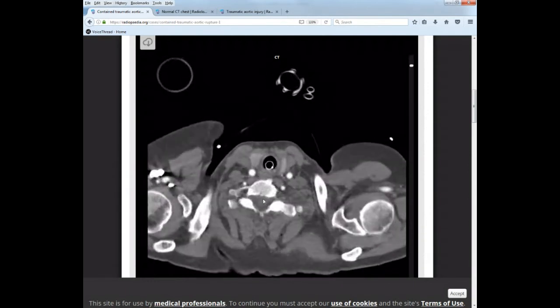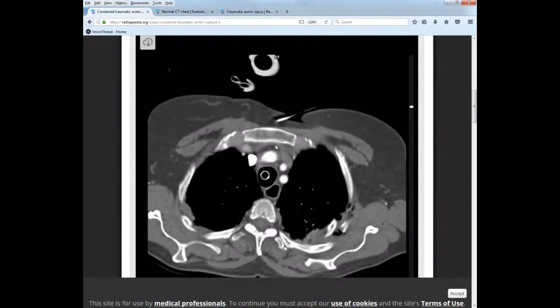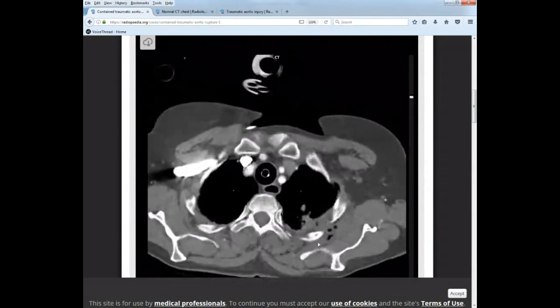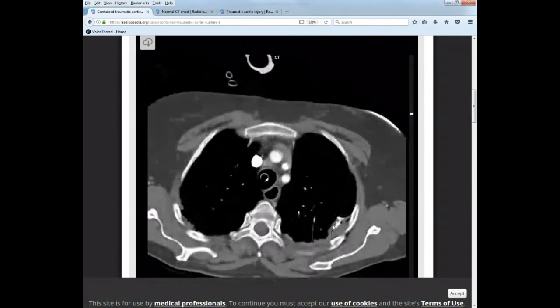We have our T-spine here, first rib coming off. So even with a traumatic injury, we can see the first rib and we can identify the thoracic inlet. Okay, we have rib fractures over here, which you can see coming in, which is part of the reason why there's a fracture right there. All of this is subcutaneous air, because some of the air in the lung is coming over here because this patient has a pneumo, I believe.